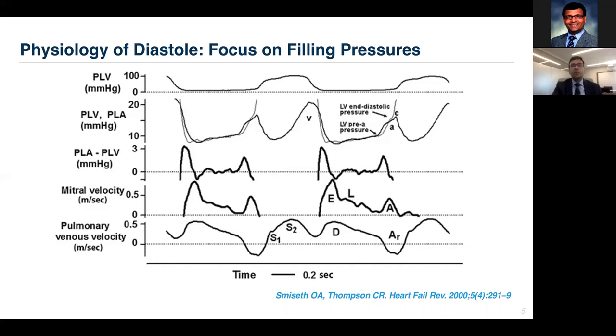The S2 is typically caused by the RV pressure pulse, which pushes the blood flow forward, with which the flow is moving inwards into the atrium. And also there's a contribution from the systolic descent of the atrioventricular plane. Therefore, the magnitude of the S wave is determined by the combined work of the RV, LV, and LA systolic function.